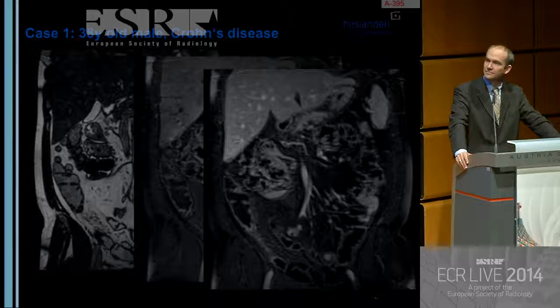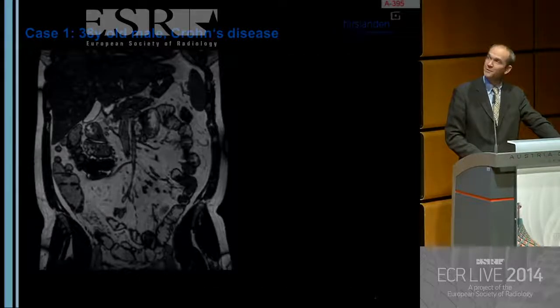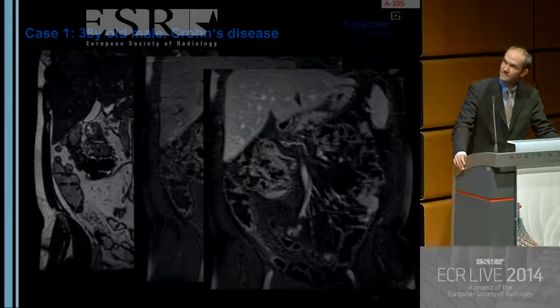Okay, so this is testing your powers of observation. We know that inflammatory bowel disease is multi-site, so can you see anything else? And I'm very impressed with the number of people getting the answers right. So it's either you're very good, or the speakers are very good, or both, probably. So see if you can get this one. Can you see anything else on those images? I can flip to these images while we wait for the results.